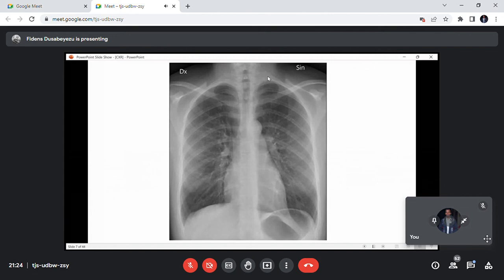You check the soft tissue. Soft tissue means what? The neck, maybe there is neck lymphadenopathy, supraclavicular soft tissues, maybe the chest wall, axilla. The diaphragm is part of the soft tissue. Even the liver, check if the liver is normal. You can have some calcification in the liver. Those are the 4 things you should look for as you are analyzing a chest radiograph.